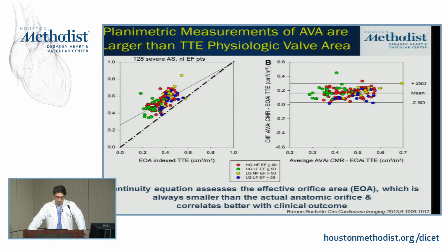And so one of the things that we try to do here in our lab, in order to avoid any confusion between the two services, is knowing this relationship. When we trace amongst ourselves, we have been very careful to under-trace just slightly. And we've noticed that gives you a much more reasonable correlation. So that's the Methodist fudge factor.